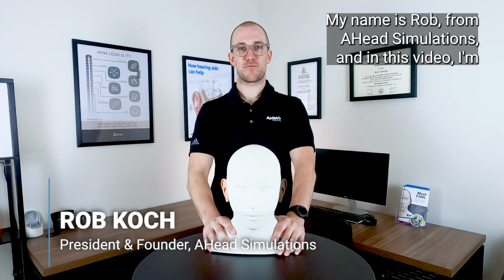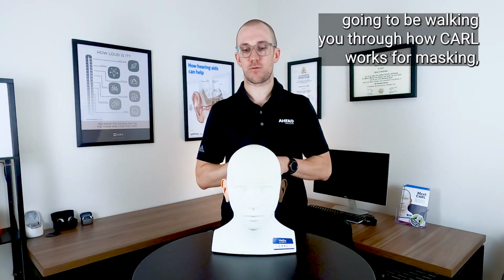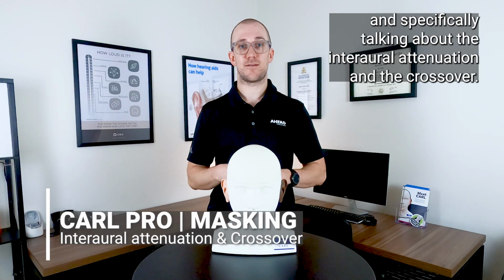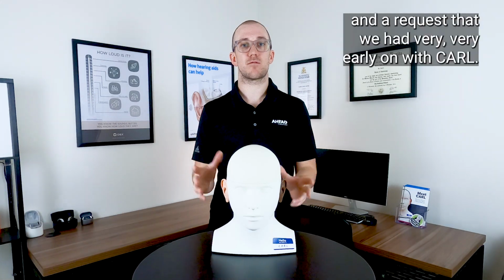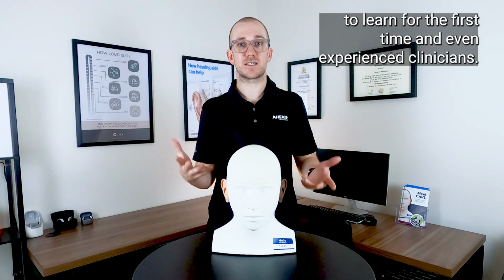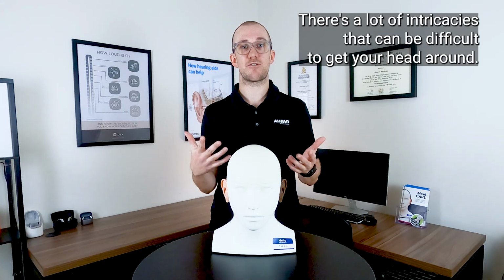My name is Rob from Ahead Simulations, and in this video I'm going to be walking you through how Carl works for masking, and specifically talking about the interaural attenuation and the crossover. So masking was a competency and a request that we had very early on with Carl. It's a competency that is very challenging to learn for the first time, and even for experienced clinicians, there are a lot of intricacies that can be difficult to get your head around.